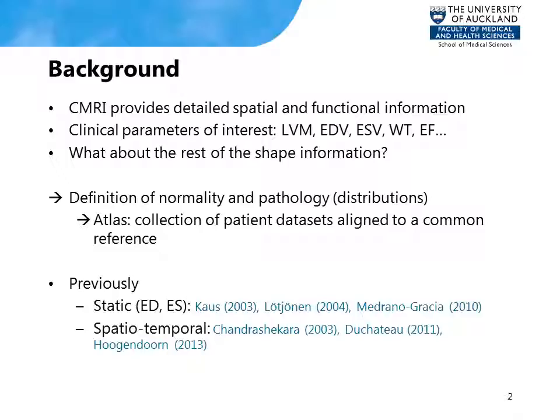In my group, we mostly use MRI. It is remarkable how much information we can acquire when we put a patient through the MRI scanner. Typically for a patient we obtain hundreds of images which we can animate into movies of the heart cycle. By fitting mathematical models, as we'll see, to these images, we can derive clinical parameters such as left ventricular mass, end-diastolic and systolic volumes, wall thickness, ejection fraction, etc. These are used by clinicians since they correlate well with certain cardiac conditions.